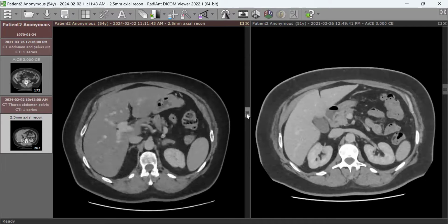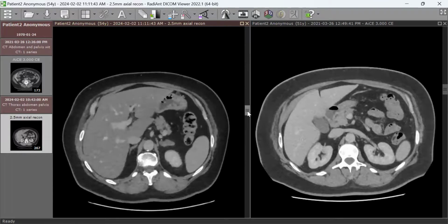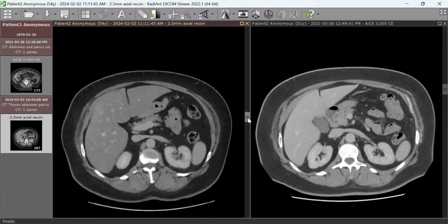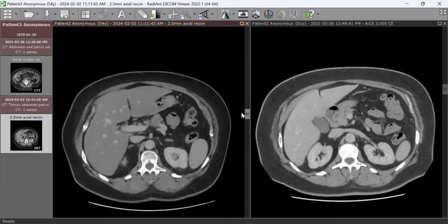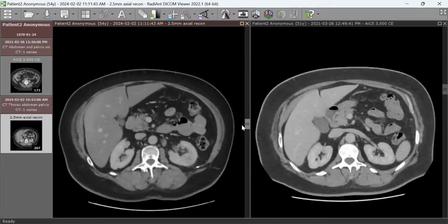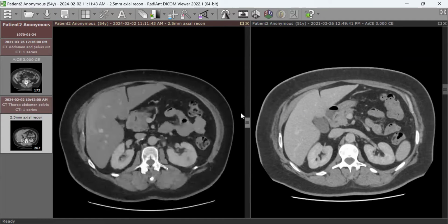So when you suspect a lesion like this, what I want you to focus on is how to go from here. Let's assume this is suspicion for RCC. So what do you do else? Where do you look in the scan? How do you further analyze the scan? I want to look at the adjacent regional lymph nodes. I want to look at the vessels, mostly the renal vein.